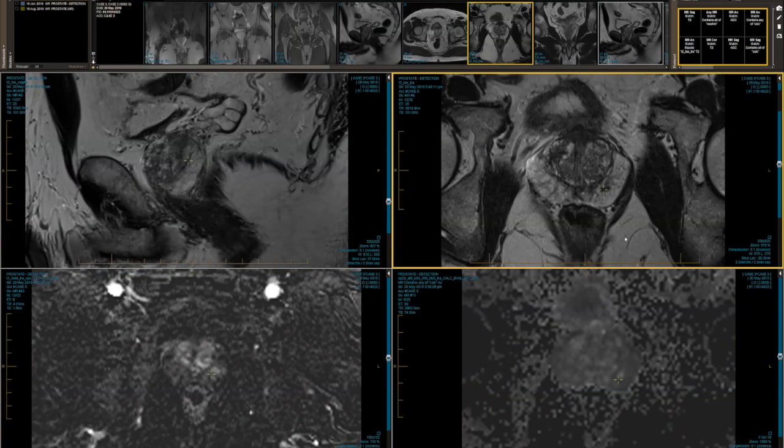I don't think it's the whole thing. It was just that it's one of those look-at-me areas, which is why I would definitely have said to sample it. And sometimes you'll have a tumor and then you'll have the little wedge shape of the gland that just collapses behind it. So I don't think that's all tumor.